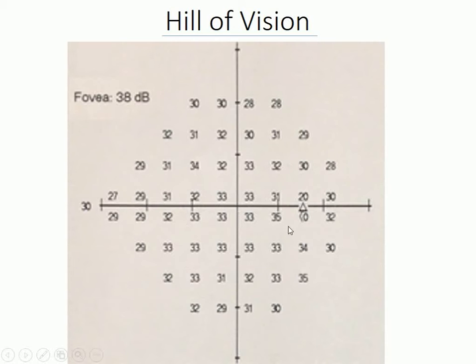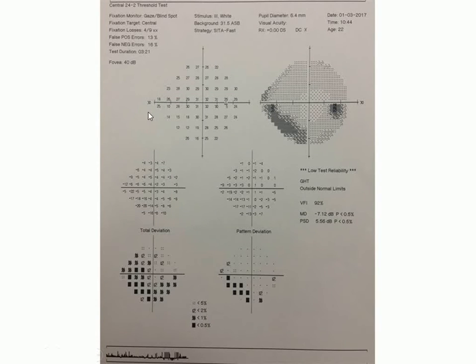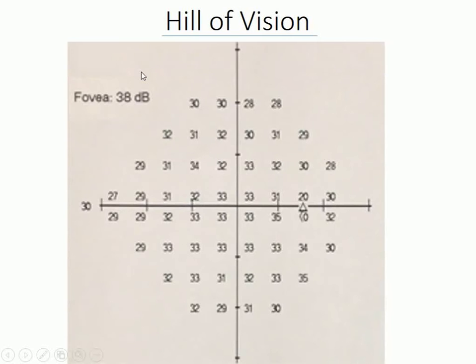That's not shown directly in the map, but it's shown on the side as the foveal threshold. And if we just move to an example here, in this particular case, here's where it shows what the value of the fovea was, 40. And we expect that to be the highest value. And so as the data is being obtained, if you're a technician looking at the screen and seeing it coming in, you can already make predictions about when something is abnormal, when it breaks this pattern.